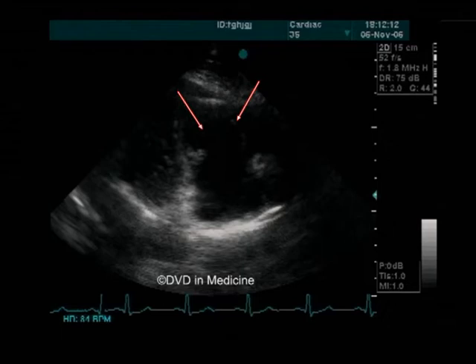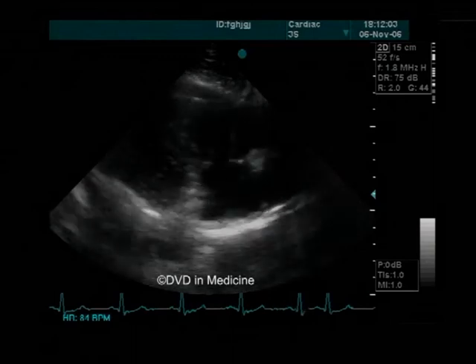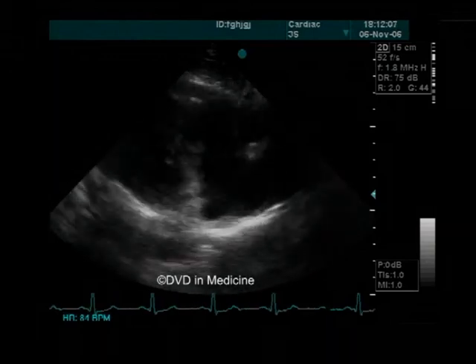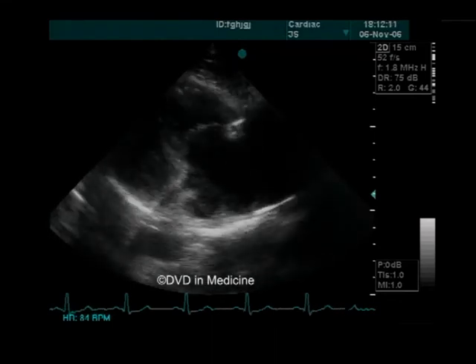Normal tricuspid valve leaflets should open like a door, so the tips of the tricuspid valve leaflets have the biggest amplitude. In the case of tricuspid stenosis, the leaflets dome in a diastole like a parachute. Doming is one of the main two-dimensional features of any stenotic valve.